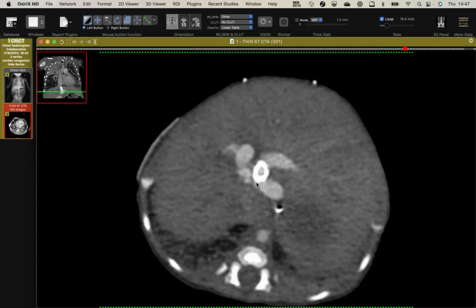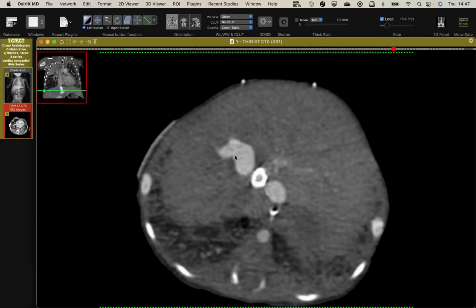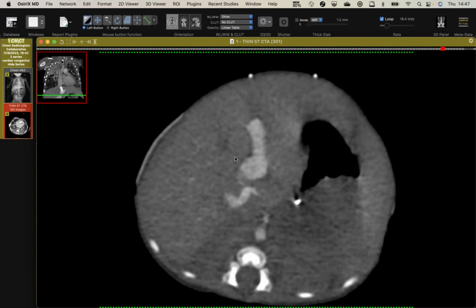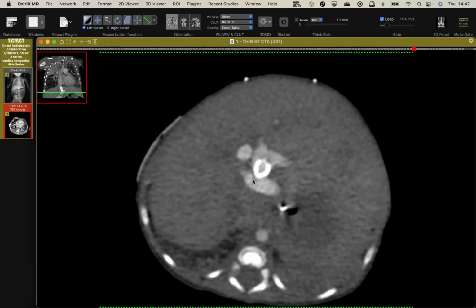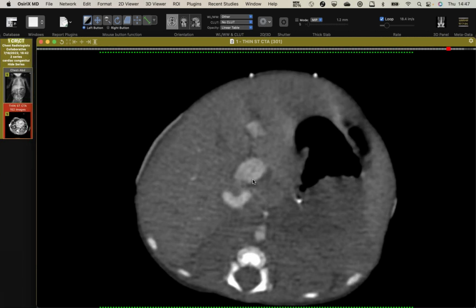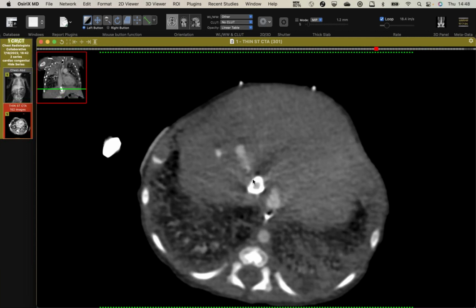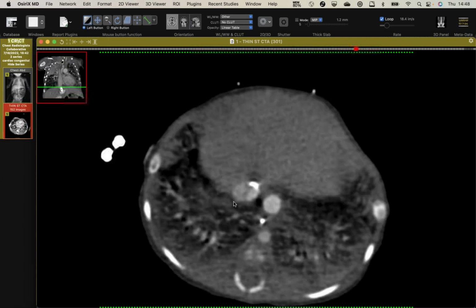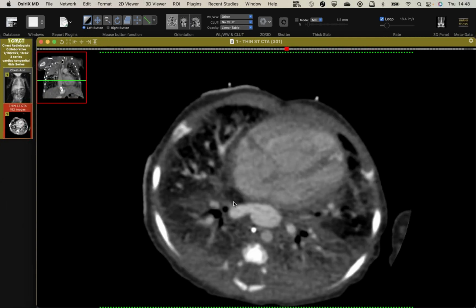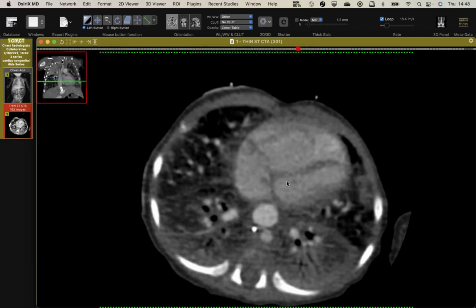Now there's a stent in the ductus venosus here, and you can see it combines with the hepatic veins right there, and then this drains into the IVC. So this is an infracardiac total anomalous pulmonary venous return or connection. There's some high-grade narrowing distally, so this is all edema in the lungs because of that. And then there's an ASD that they saw better by echo, but you can actually see a little bit right in here. There's a secundum ASD right back in there.